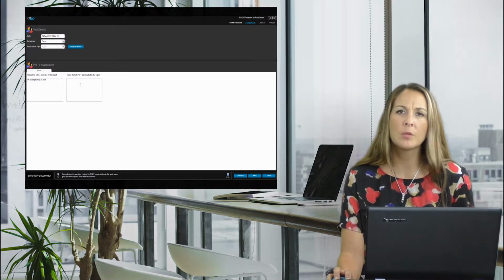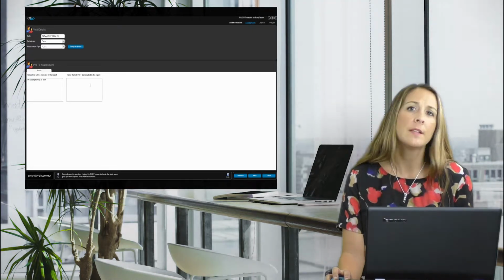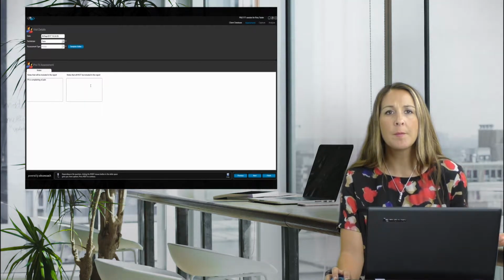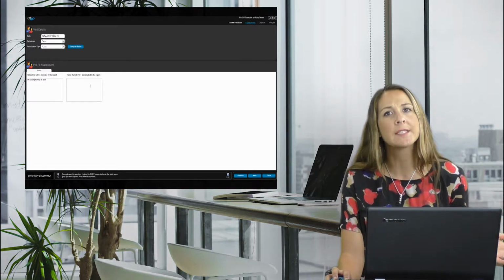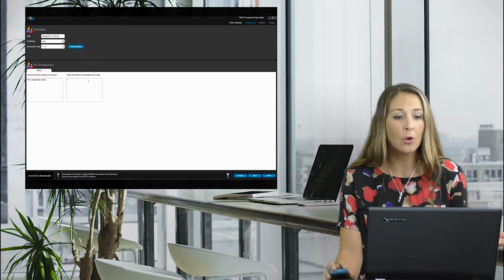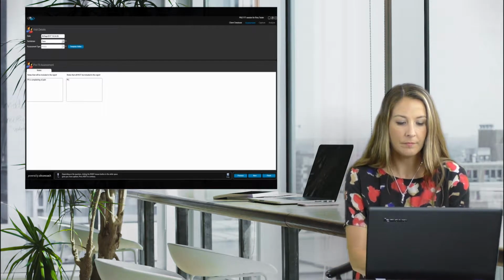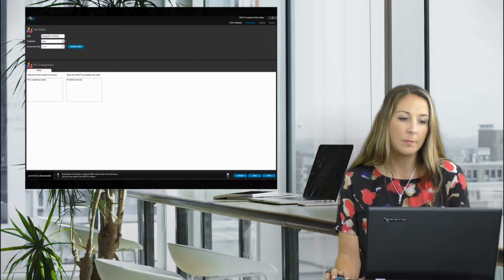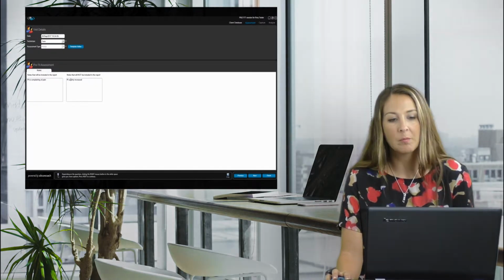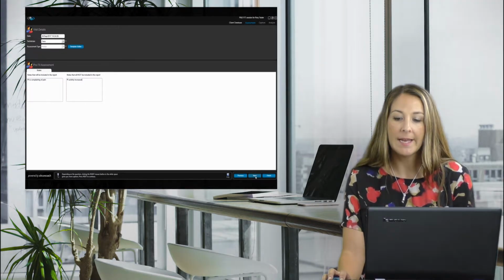And then maybe some notes that will not be included in the report. We could base this off of, let's say he has a Fitbit and we download that information and we see that his activity has actually increased. And so that might be something that we might want to know. So patient activity increased. And we can put that in either, the piece that will be included in the report, or maybe the piece that won't be included in the report. And then we will hit next.